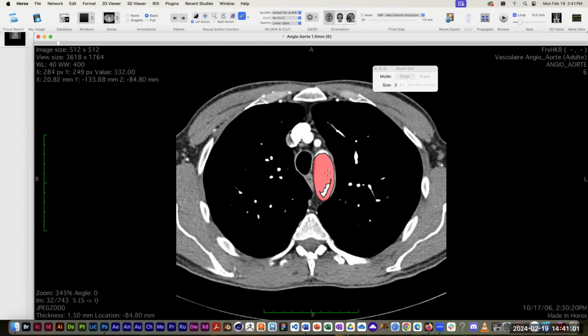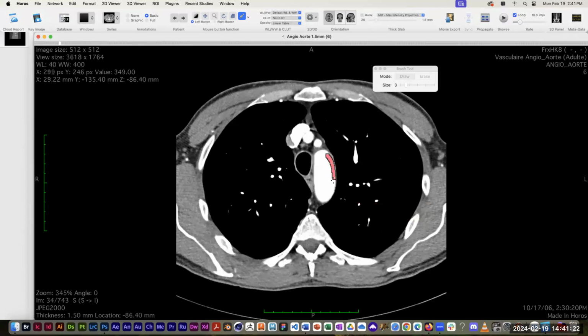Being a little sloppy just because I'm trying to do this quickly for the sake of the demo. This is my first time trying the aorta. I was actually going to try to demonstrate a thoracic vertebra to you, but I know how awful it comes out most of the times that I've tried it. So I made a last minute executive decision here to try something different.